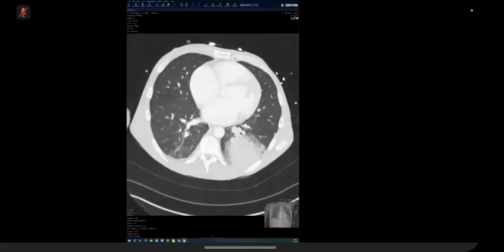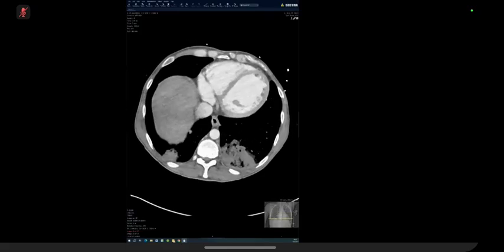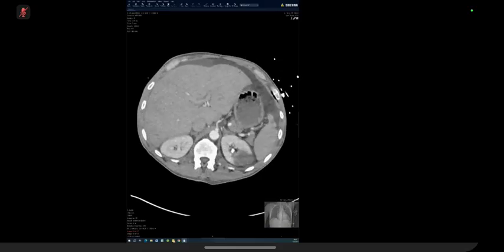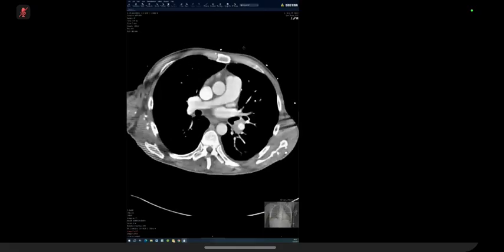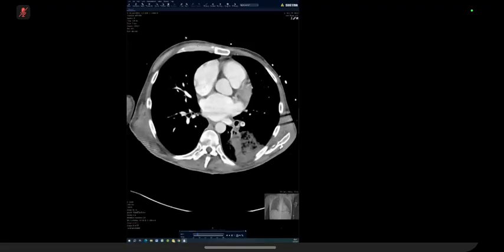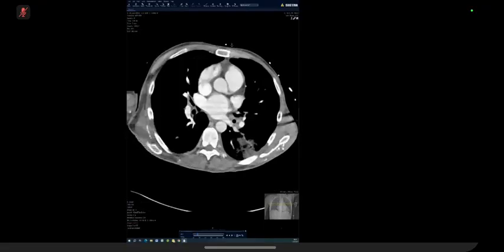Right. Okay. So bilateral. Sorry, I'll just have a better look at that. Okay. Can I just see the left main pulmonary artery as well? I just want to see if there's. It doesn't go high enough. It's a cardiac CT. That's all right.